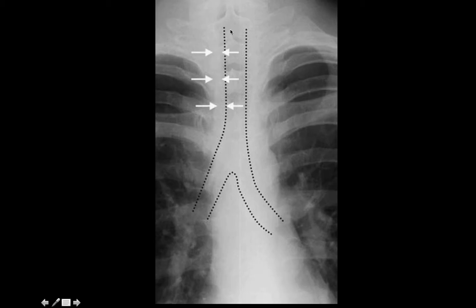So of course, when you see the trachea, don't forget to look at these areas, because this is very important. If there is widening, there are so many common pathologies that we usually find here. So for now, this is just the paratracheal area.